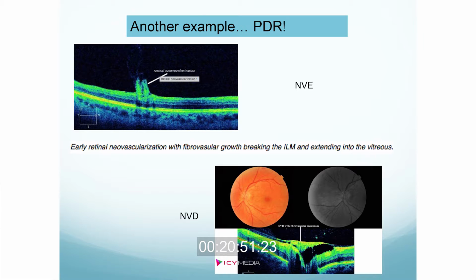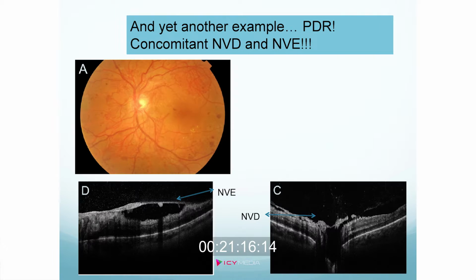This patient, you can see the nice contour of that nerve that we talked about, but you can also see that there's an abnormal lip of tissue, that big fibrovascular shield or scaffold that is forming from the neo. So this case may actually be more advanced than the previous case because this one's beginning to form a full scaffolding of tissue, meaning that there's been some fibrosis.